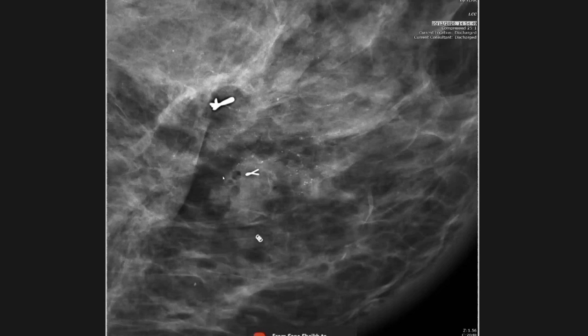But because she's had surgery, people who have fat necrosis and scar tissue can calcify that tissue in different ways, but generally that tends to be a lot more chunky calcification. So I don't know. Imaging wise, I don't think there's much between a 4 and a 5. I think it's probably a bit more branching, a bit more sort of in the ducts. I'd go for a 5. If it's a bit finer and scattered, then I may probably err on the 4.